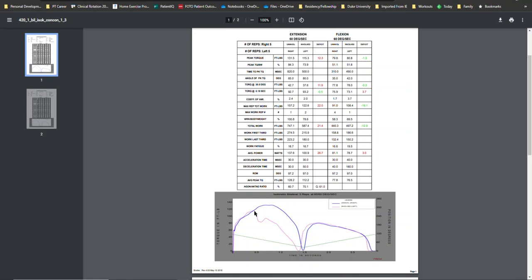This individual just has some moderate to significant knee osteoarthritis of the medial compartment with a varus deformity. But if he was to ask me if he could run and I only went off my peak torque, I could be fooled, and he likely would come back with some form of knee effusion. So more work needs to be done to fill out the area under the curve.